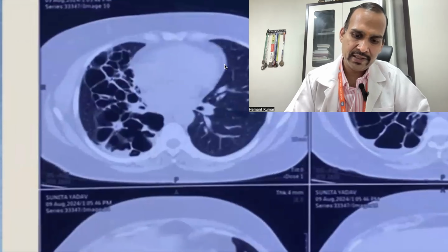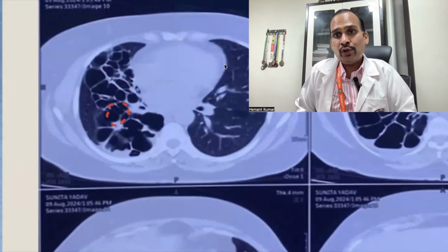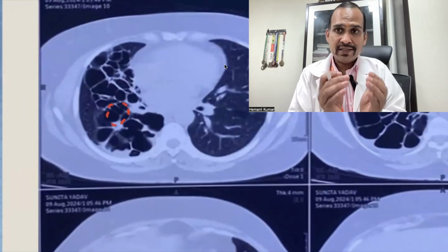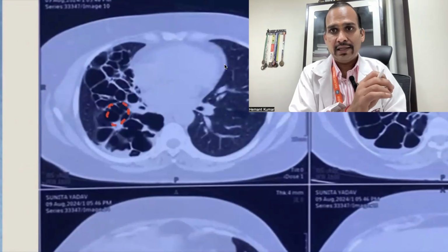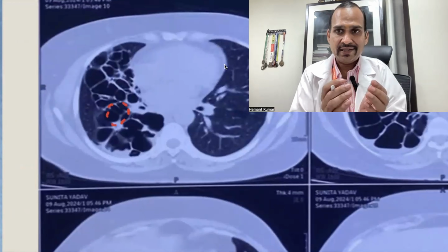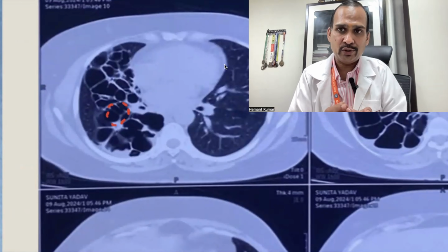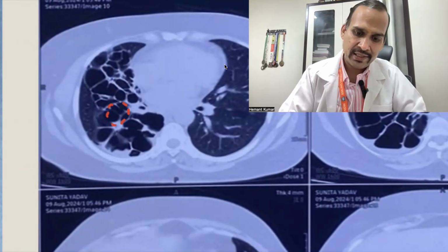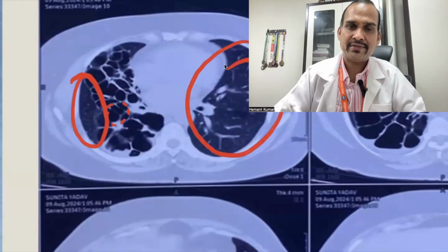So this is bronchiectasis. And if you see the CT scan, you can appreciate better. You can find the cystic lesion. And one more thing you can appreciate, because of the large cyst, there is collapse of lung parenchyma, collapse of alveoli. This is cicatricial because of scarring, because of disease. You can appreciate there is little lung parenchyma as compared to this side.